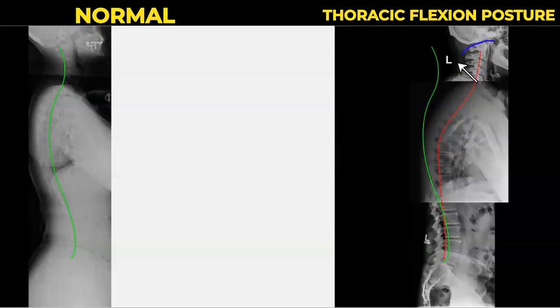Why? Because the actual upper body weight and load, as it's called, is now over this spot here over space and not through the body column. And that's why the load of the body is not distributed properly, and the stress has to accumulate somewhere, and it accumulates at all the bend points, okay? All the major bend points. So again, that's a classic flexion, thoracic flexion posture.